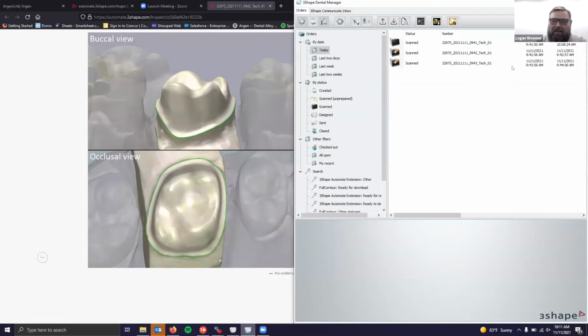Thanks, Rob. So the other option I have is, let's say you were satisfied with 95% of the design, but maybe you weren't 100% satisfied with what the marginal ridge looked like or something like that. You do have a couple of options. Now, for Scanbox customers, their options are more limited because you cannot design anything. But for Scanbox customers, you can reject that, send it to full contour or something like that.